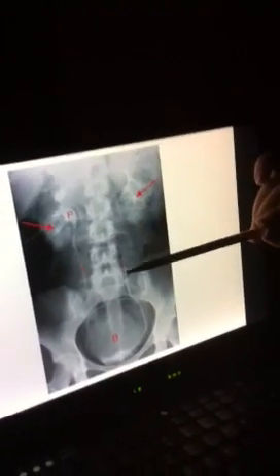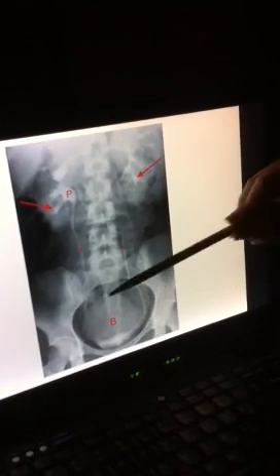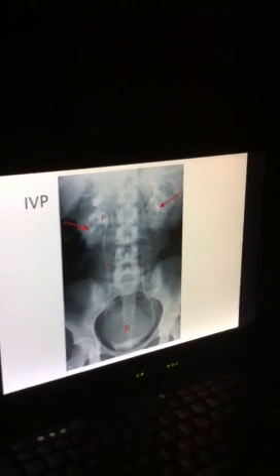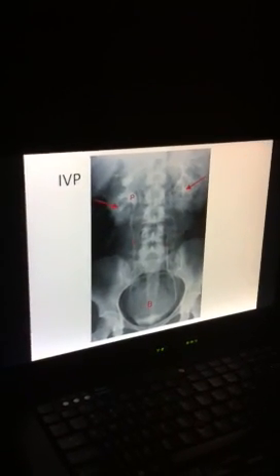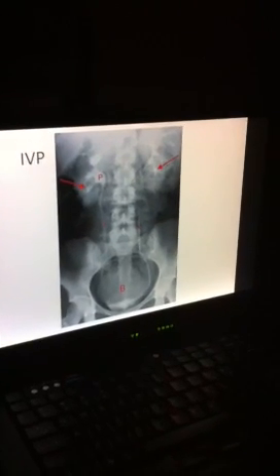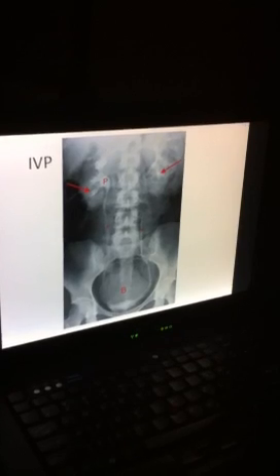And then what about this? Ureters. You have one on both sides, and then down here. Yes, so this is used to view the renal system. It used to be used to find kidney stones, but now they use CTs, so they don't really use this anymore. But you can see some stuff with anatomy, so that's why you're seeing it. Any questions about this?